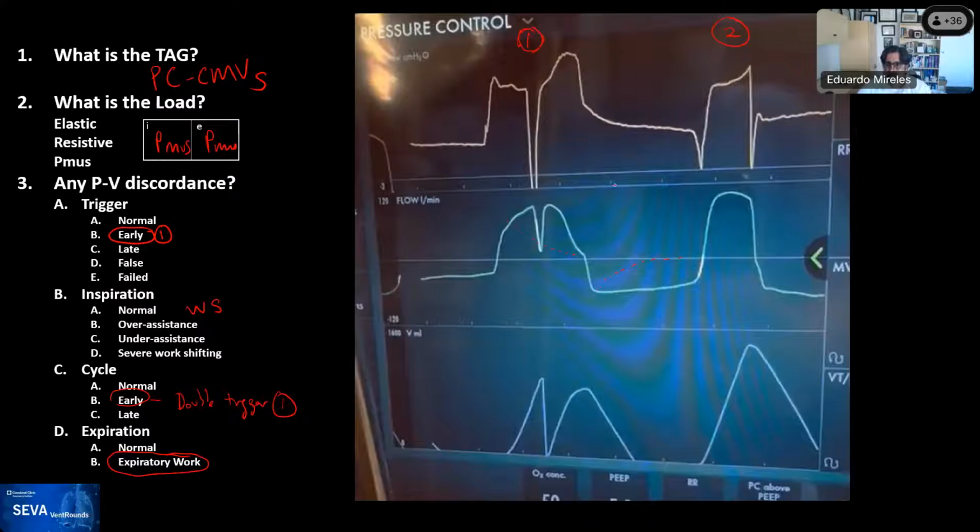Yeah, and this is, of all, there are many gaps that exist right now in the taxonomy and how to classify things. But the fact is that you're recognizing that there's a major drop in pressure that this patient is generating. Actually, look at the amount of drop that the patient generated on the prior one. It went below -3.